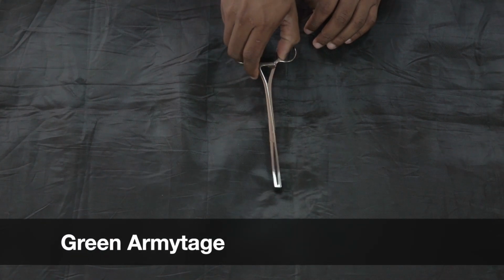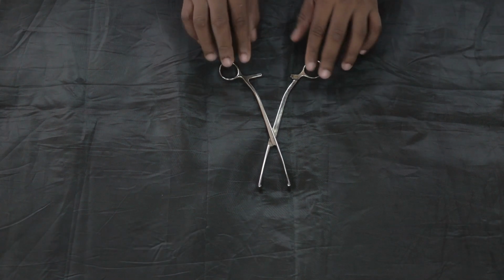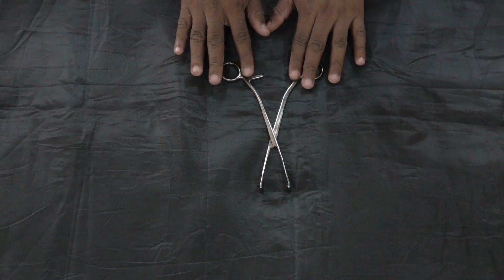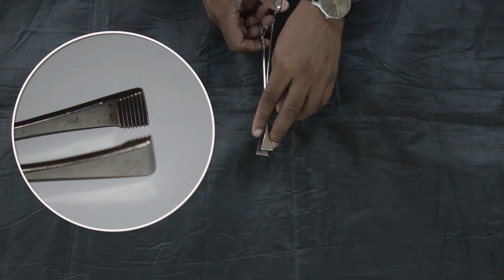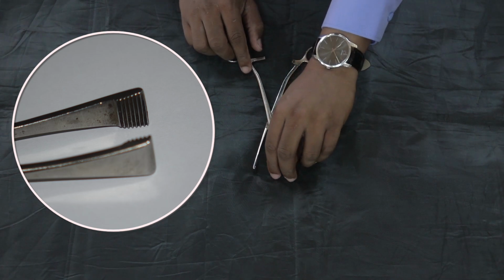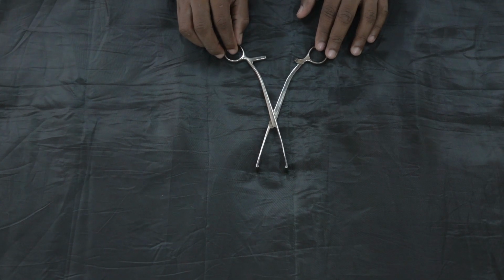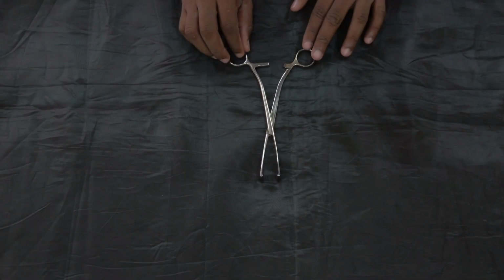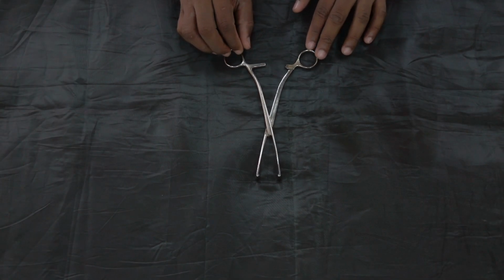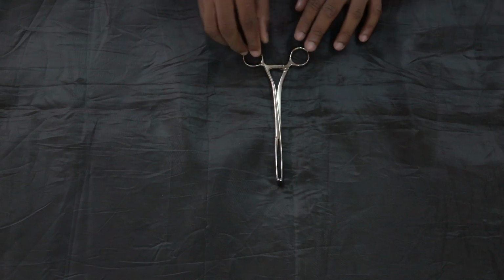And this is called Green-Armytage forceps, which is commonly used in obstetrics. It has a handle with lock, straight shaft, and the jaw is specially designed wider and without fine teeth, so without any damage, it helps to hold the cervix and to do the cervical repair. It is also used in cesarean section to hold the cut edges of the uterus. This is called Green-Armytage.